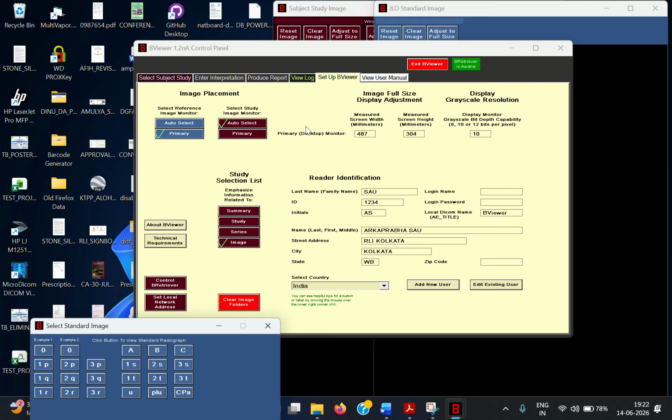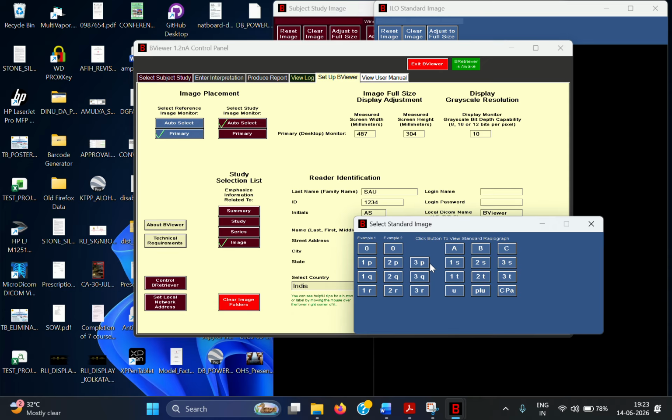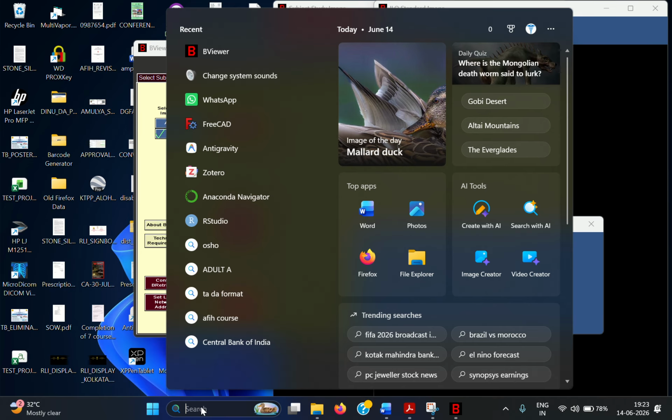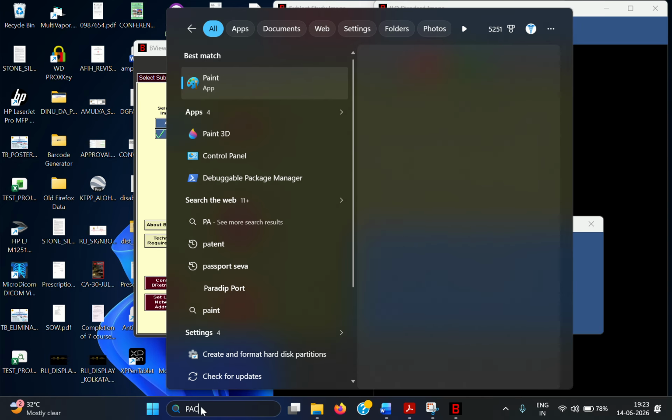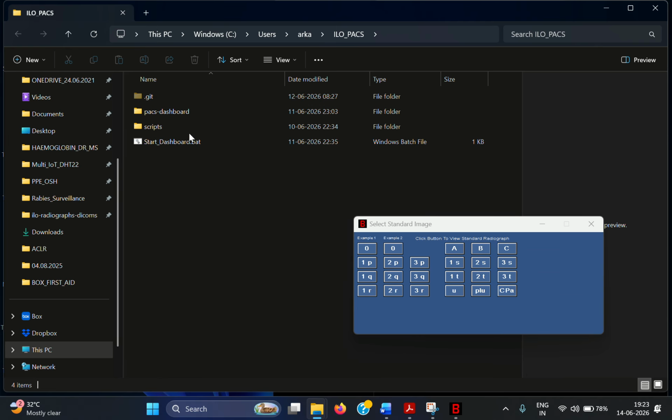For that, I developed a localized PACS system. It is nothing related to uploading into any open domain, so it is totally secure. We can use that to get any X-ray through the PACS system. I'm going to demonstrate that, and also how we can use the entire system.